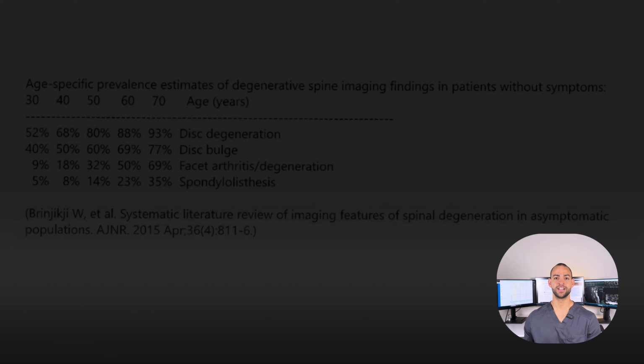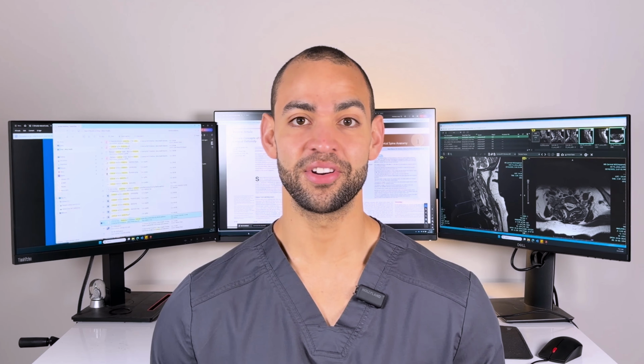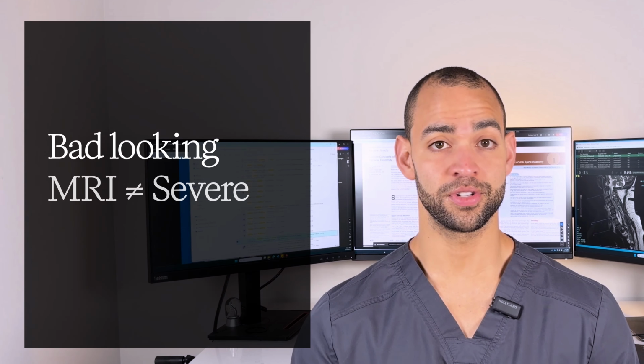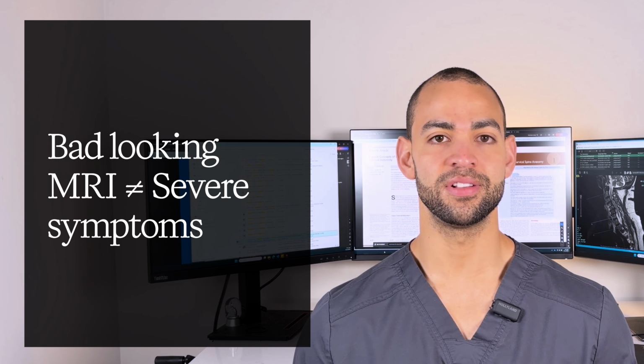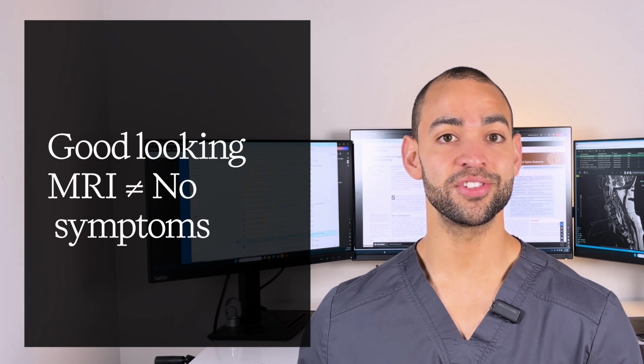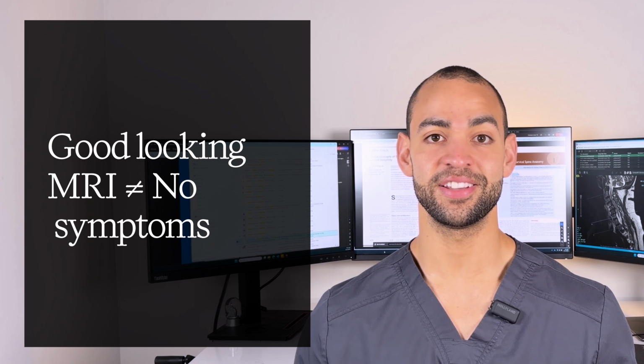completely fine. On the flip side, I've had patients come in with debilitating arm pain, barely functional, and their MRI shows only a mild to moderate herniation. Their suffering is real, their MRI just doesn't look dramatic. This means two things. First, a bad-looking MRI is not a surgical indication. Second, a mild-looking MRI doesn't mean your pain isn't real or isn't significant.